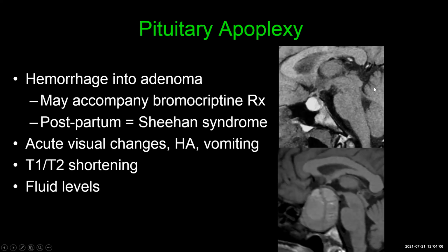This is a scan without contrast on that T1 weighted image. And here's our little pituitary bright spot back there, but the rest of the gland should be pretty much the same signal as the brain. This one is way too bright, this one massively enlarged, and also abnormal signal, definitely brighter than the brain. Both of these are patients who bled into their macroadenomas, causing pituitary apoplexy. That's the optic chiasm. Look how it is stretched along the superior surface of this massively enlarged hemorrhagic gland.